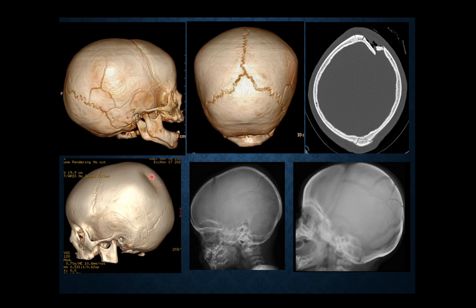This image shows a depressed fracture. It's typically known as a ping pong fracture. It is a depressed inner table of the skull, typically seen in pediatric patients. Now in these two images you can see the coronal suture and lambdoid suture. Here you can see a very sharp line. When I use the word lucent, it means black.